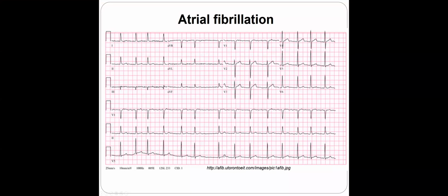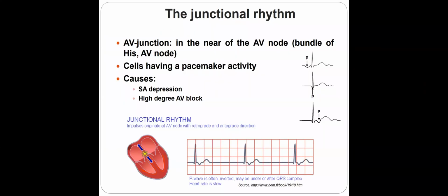So if you do see some fibrillatory waves and a P wave, it's not atrial fibrillation. That's noise. And the noise can be seen on top of the T waves and on top of the P wave as well. All right? Yes. Good.